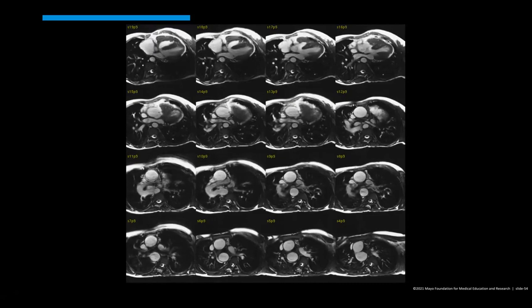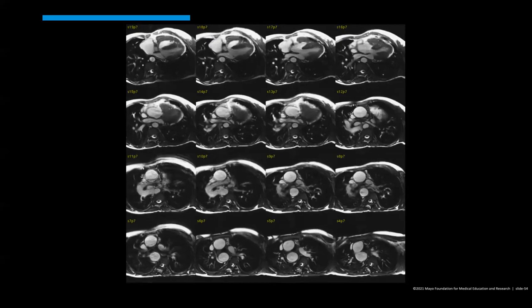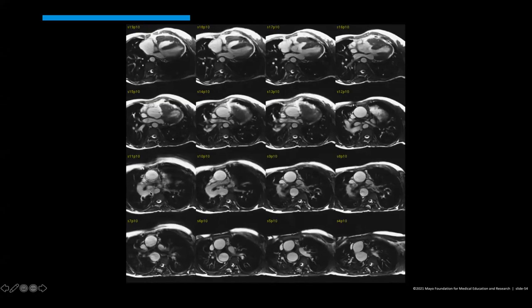And now in this case, they're so large, they're massive, so massive aorta to pulmonary collateral arteries, or MAPCAs, that was enough. It's like a shunt, but in this case, that's how she was born, okay? So we have these very large MAPCAs, or collaterals, between the aorta and the pulmonary artery. And at this point, she would undergo repair.